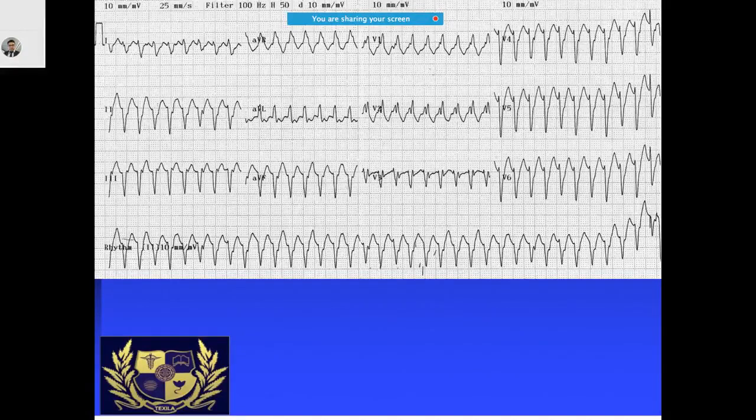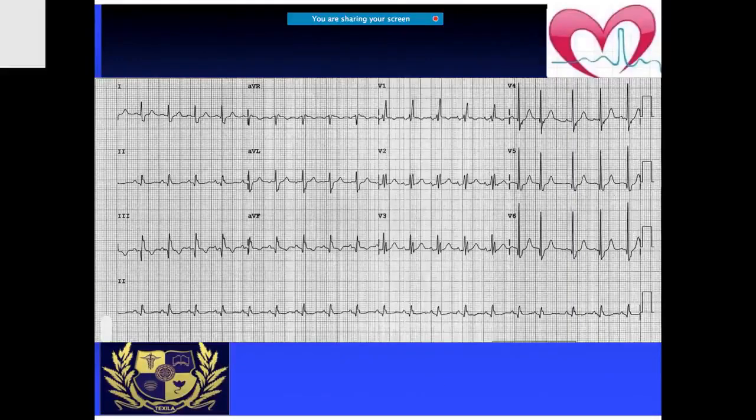And then what is happening in this ECG now? Again, start looking from the basics. What is happening in this? We notice there are signs of AV dissociation. There is a tachycardia, right bundle branch block. Extreme axis is there as well, northwest axis in leads 1 and 2. And the RS ratio is less than 1, especially in V6, which is indicative of ventricular tachycardia, right? So what do you notice in this ECG now? What is happening over here?